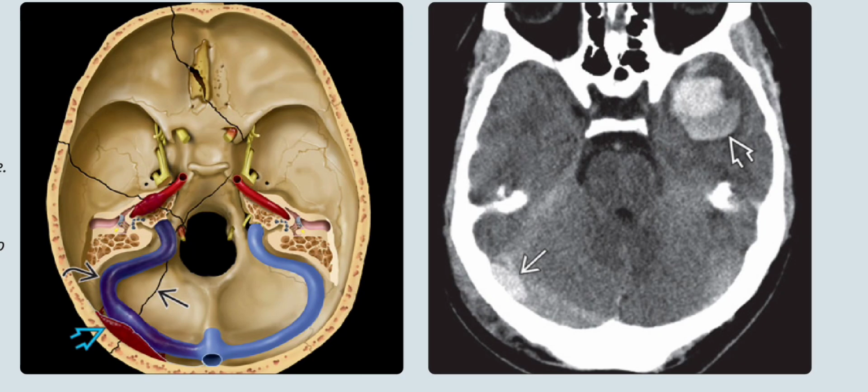Left is the axial graphic, which is depicting different basilar skull fractures. It shows different basilar skull fractures that cross and may injure the important vascular structures. Note the linear skull fracture, which seems to be crossing the right transverse sinus. The lacerated sinus causes a venous epidural hematoma to accumulate. The injured sinus often thromboses, as is depicted here.